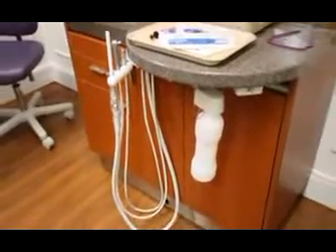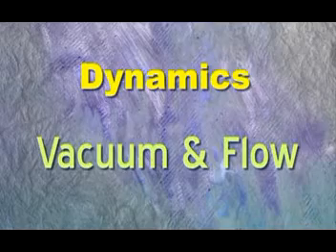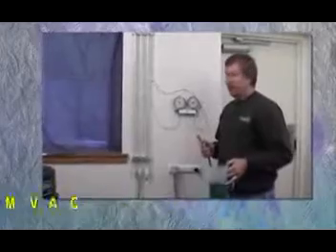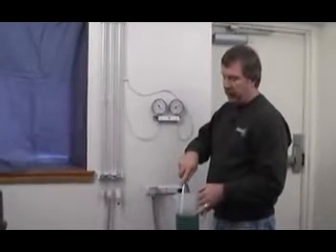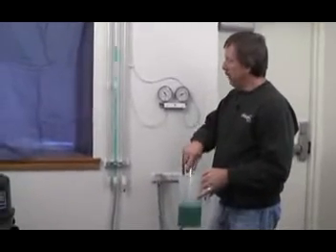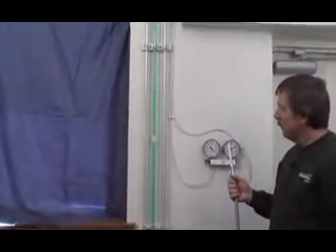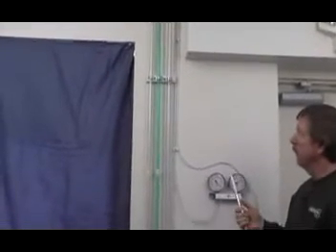The purpose of this video is to demonstrate the actual dynamics of vacuum and flow with the help of Ramvac's transparent pipe system. Today we're showing the importance of flow in the dental vacuum system. The flow of air to the dental vacuum pump moves liquids and solids. We're going to show how this works by sucking up liquids into a pipe, which simulates the trunk line in a dental office, to show what happens when you suck up liquid and then shut off the suction and the liquid cannot move.